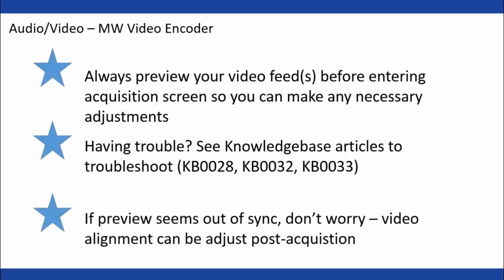And if the preview seems out of sync, you don't need to necessarily worry too much, because not only is the preview subject to some latency, even more so than the actual video recording, but we also have tools within BioLab where we can adjust the video alignment both based on one another, if you have multiple videos, and based on the physiology after they're recorded. And we're going to talk about that more as we talk about file viewing next time.